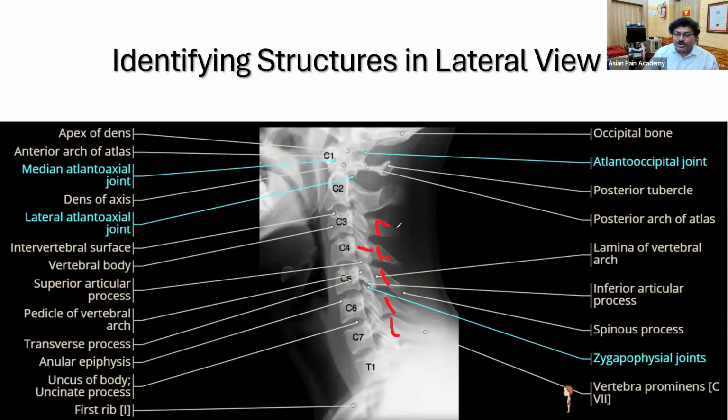So the last portion that I have not asked you are the spinous processes. Remember, spinolaminar lines are not exactly J-shaped. In fact, if you look at the spine from the posterior side, inside it is straight, but the bony density is such that under fluoroscopy, it looks like a J line or the spinolaminar line.